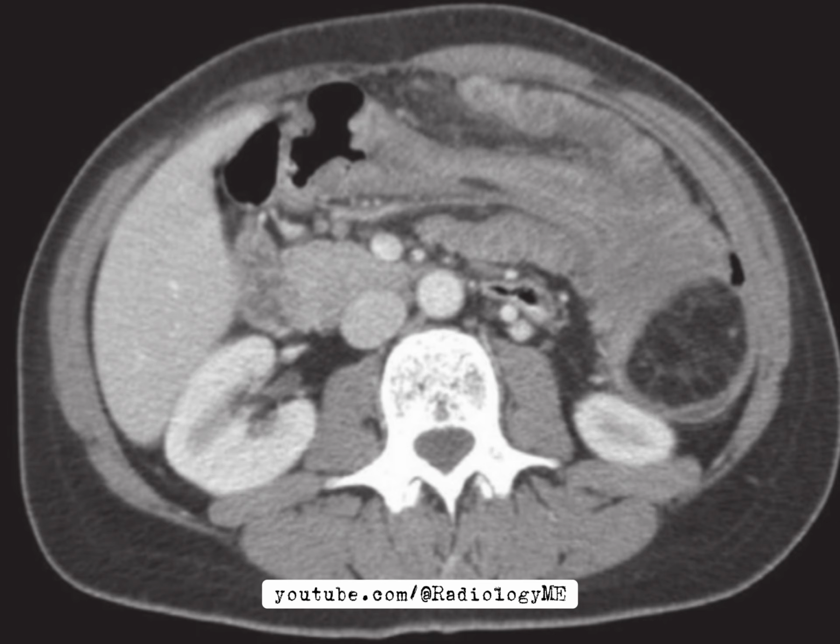Essentially, the proximal segment of the bowel, which we call the intussusceptum, invaginates into the adjacent distal bowel, or intussuscipiens. This telescoping effect can happen anywhere along the bowel. In this case, we are seeing it in the small bowel, but it can also occur between larger segments, like the colon, or the junction between the large and small bowel. In adults, this condition often presents with a range of symptoms, including intermittent or chronic abdominal pain, nausea, vomiting, and sometimes fever or diarrhea.